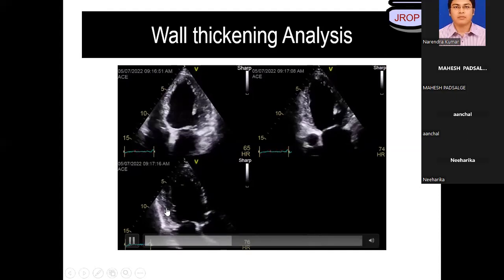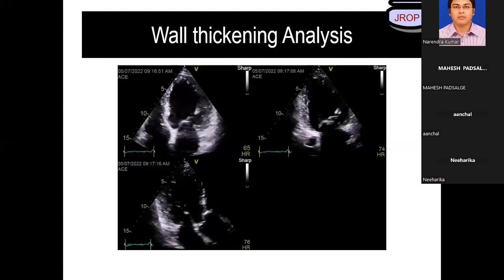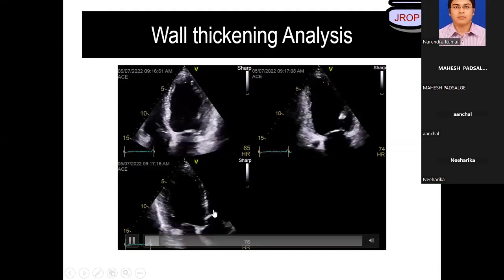This is anterior wall, sir. I'm sorry, Shashank must read. 0/5. If you can't identify this view, what this view is, and if it's a 3-chamber view, okay, I'll take it for some time. Then this cannot be anterior wall. This cannot be inferior wall. This cannot be the other wall, what you said, lateral wall.